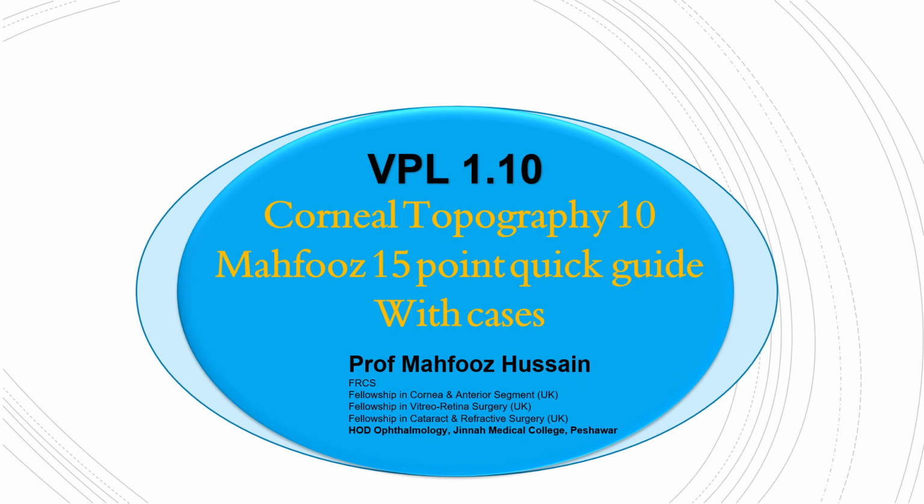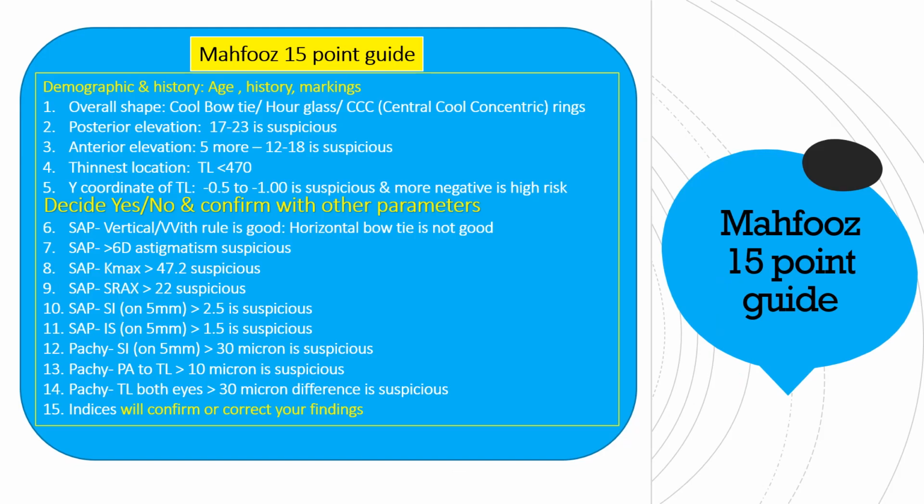This is VPL 1.10, which is a continuation of VPL 1.9, and in this video we'll discuss 15 common topographic presentations of cornea. Just a quick review of the 15-point guide.